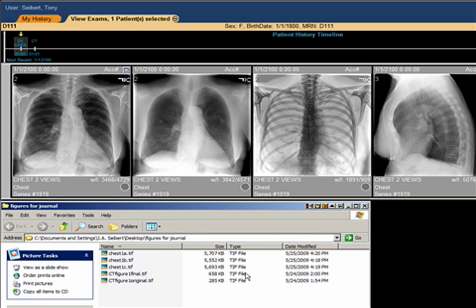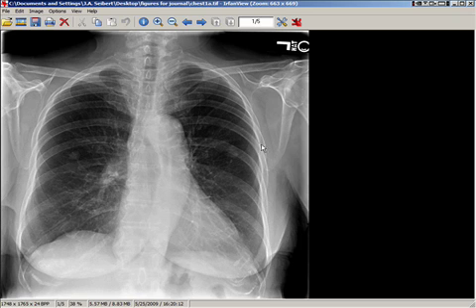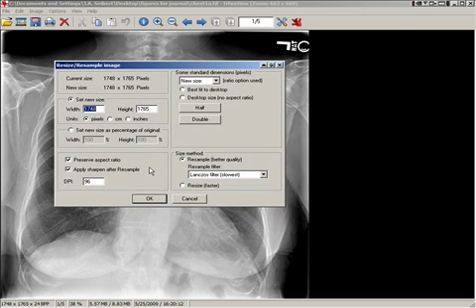The next step is to use the image processing software. With the IrfanView software open, let's go ahead and select chest 1A. We see that this particular image looks very nice in terms of grayscale rendition, 1748 by 1765 by 24 bits per pixel. Moving to the Image Resize Resample menu, what we want to do for this particular example is change the resolution to 300 dots per inch and set the inches for a full page, a width of 6 inches, and you will see that the height will automatically correspond.